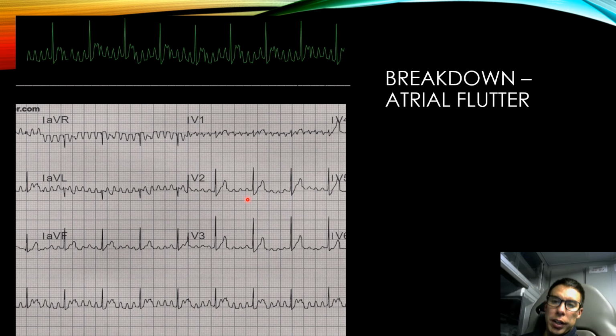So are these sinus P waves? Let's run through the steps of that. Are they upright? Yes. Are they round? No, because if we look at this bottom lead, see how pointy those are? And I said in other videos, sometimes that's not a big deal, and that's true. It just takes some practice to get used to what is kind of within normal that might look abnormal for sinus waves and what is abnormal. And this is not sinus, you can just tell with experience. They're just too tall, too pointy. It's not sinus.